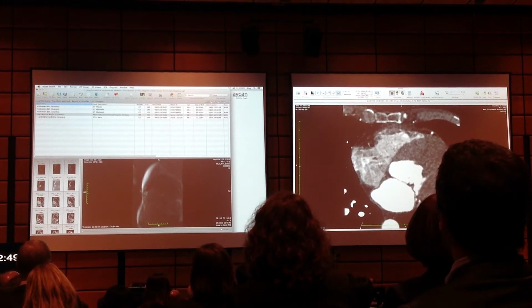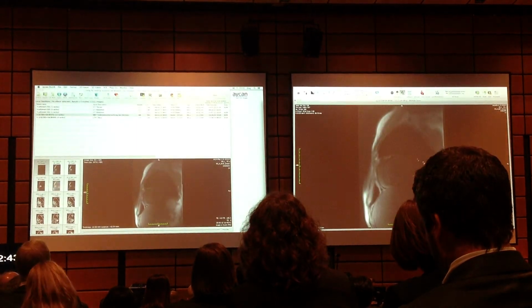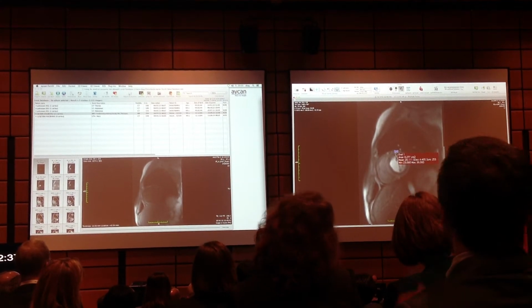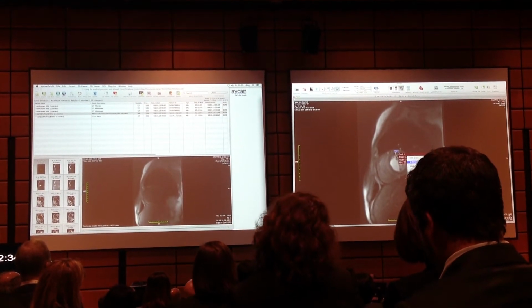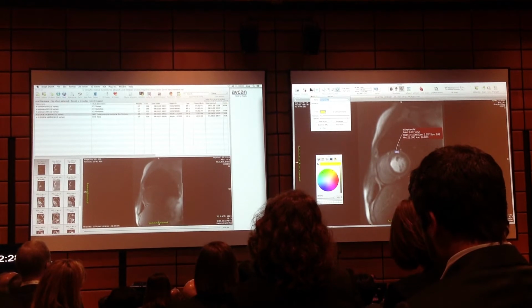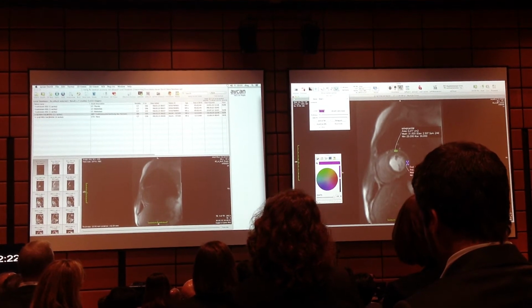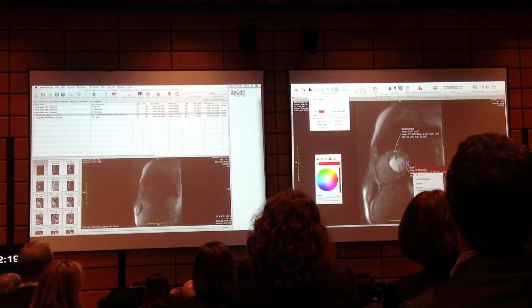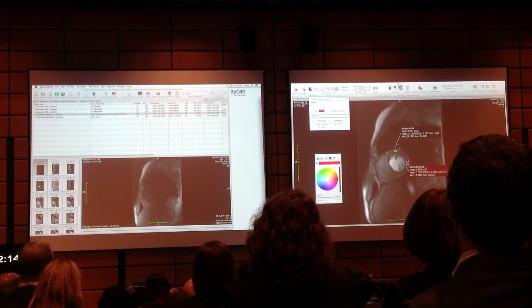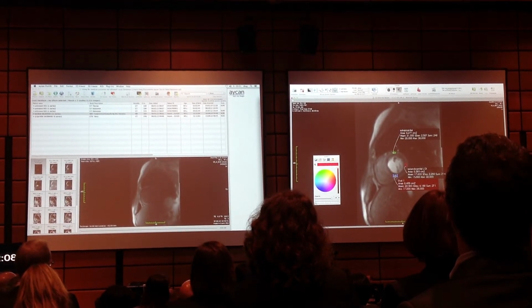I'm going to load the stress MRI into the 4D viewer so that I can assess the time. And now, for the semi-quantitative analysis, I have to place some probes here and give them a name and also a nice color. Green here. Let me do one here at that area. That's the part for the LCX. And this point.